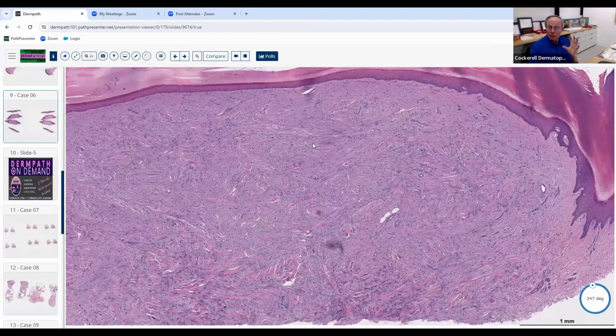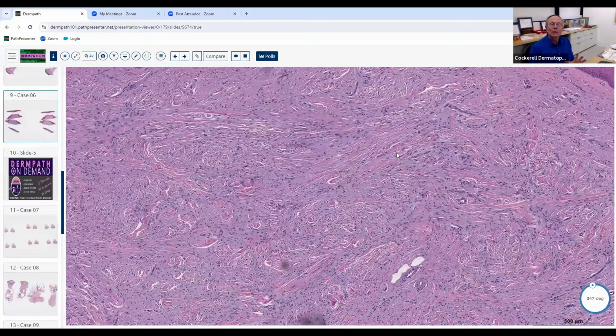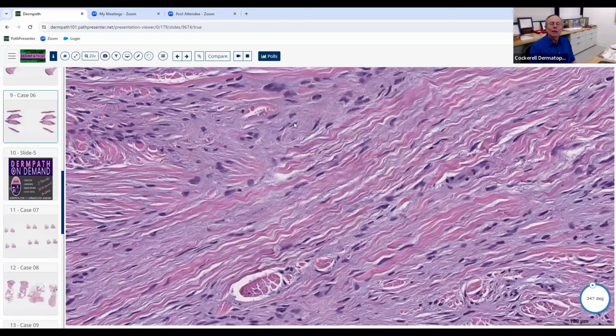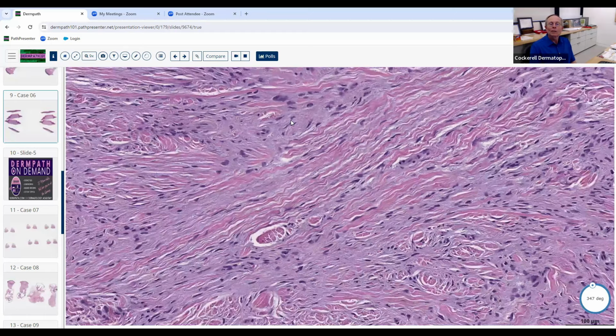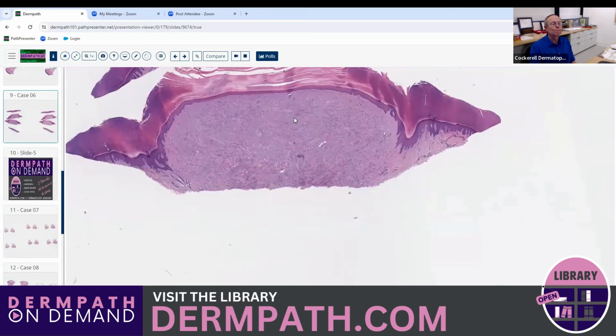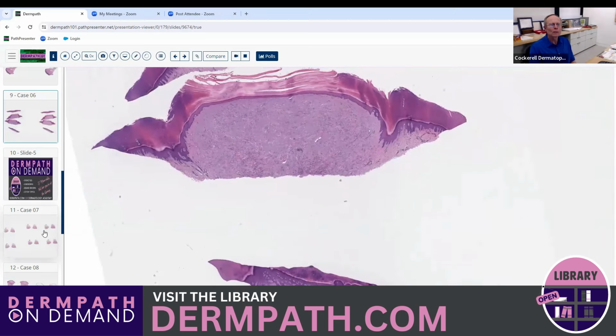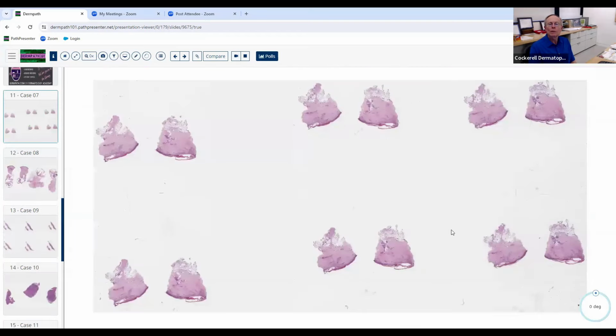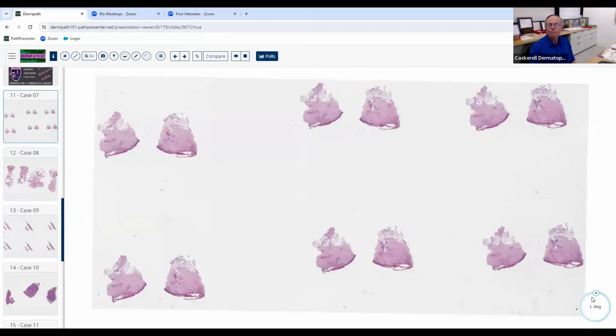They might say basically an acquired digital fibrokeratoma. Well, that doesn't have the mucin either. So again, superficial acral fibromyxoma. So remember this lesion. You might encounter it. They might show it to you, and they might expect you to be able to recognize this and understand the difference between this and some of those other entities. Pretty unusual, pretty rare lesion. I'm not sure if they will show it to you, but at least you've seen it now.